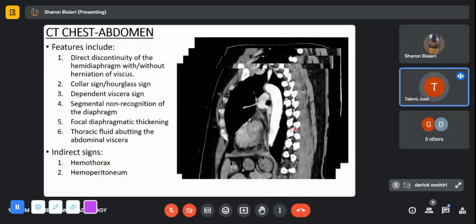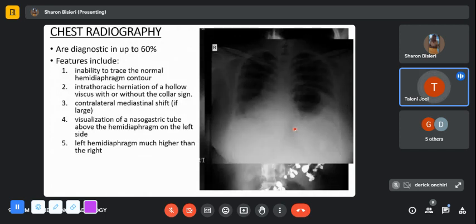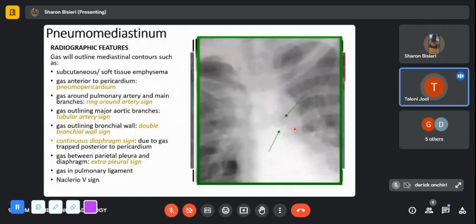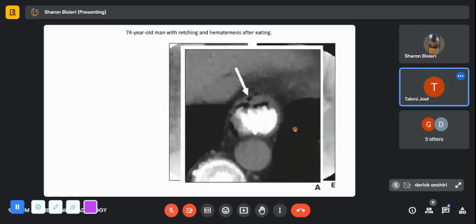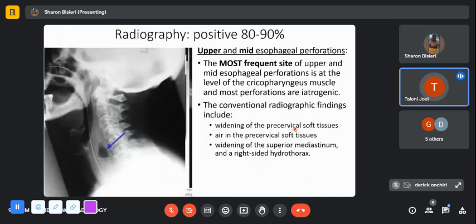They are useful. The lateral radiographs are very useful in helping to localize lesions, although I've noticed that for some reason the radiographers don't like doing them. Even when the requesting doctor specifically writes that they want AP and lateral views, most of the time only one view is taken. I'm not sure why that is.